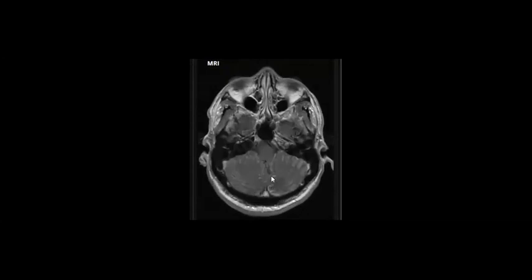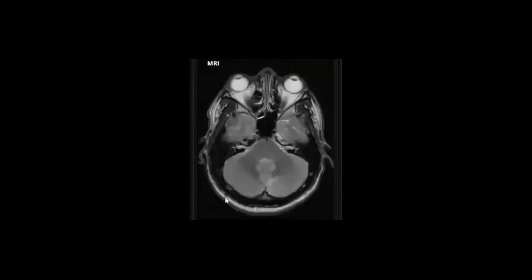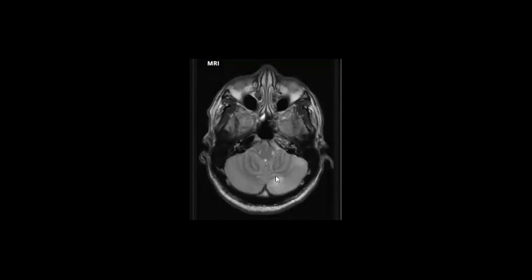Look in this area. What do you think about this patch? High signal intensity, and there is obvious restriction of diffusion here. So this is the diffusion image, and you can see the restriction. So there is infarction.